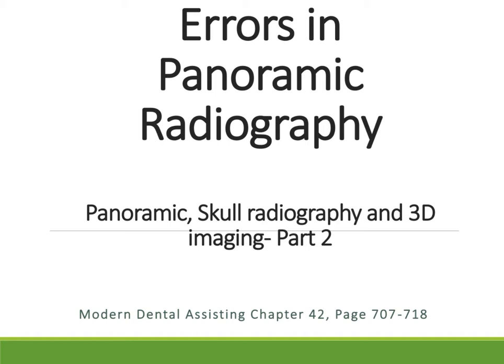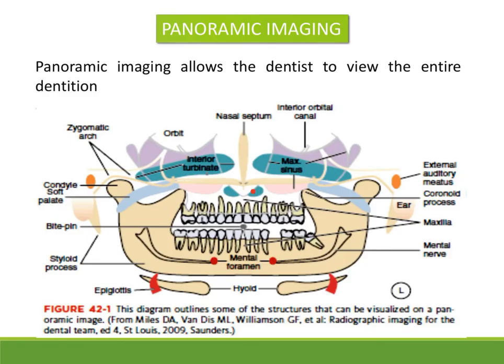So, what all errors can we expect? To know what the errors are, you have to know what is normal. So, this is the normal appearance of the structures that you see in the panoramic radiograph.